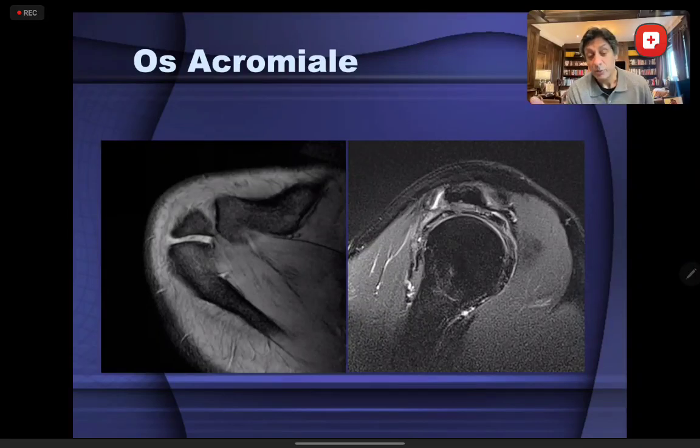So we are showing you everything in the reverse order. I've just shown you first what we would look at when we were reporting these MR scans, and then I'm showing you some examples of what to expect, how these things look.